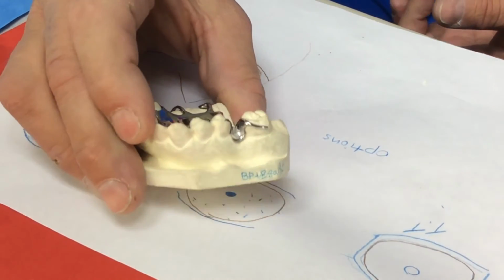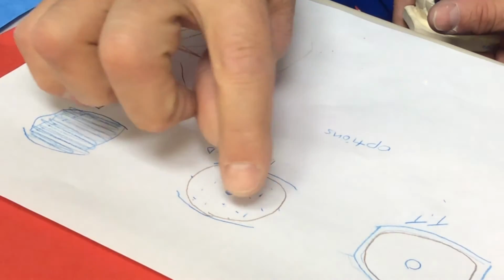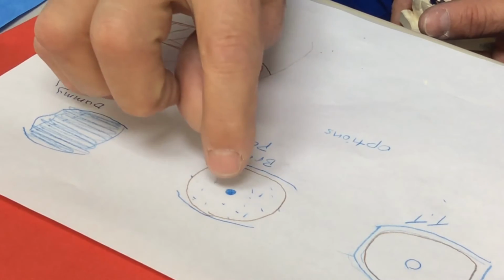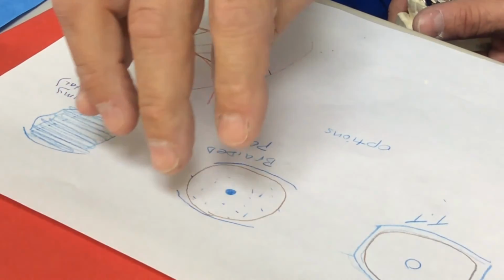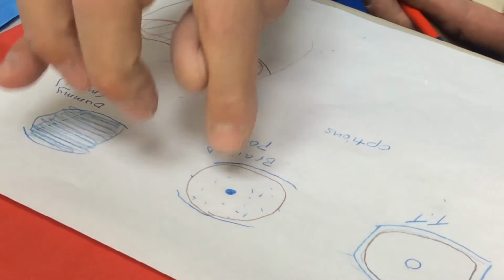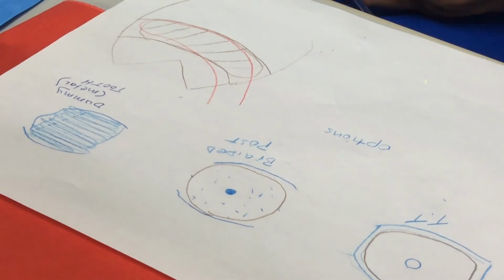But instead of having that one post up the middle, it's going to have lots of little teeny nodules that are cast as part of the framework, and it will have a braided post in the middle, and the tooth will be adhered to all of those little speckles by a little acrylic, but the acrylic is still going to be within the metal framework. Again, it doesn't really have an acrylic flange. If you want an acrylic flange, you're going to have to order it.